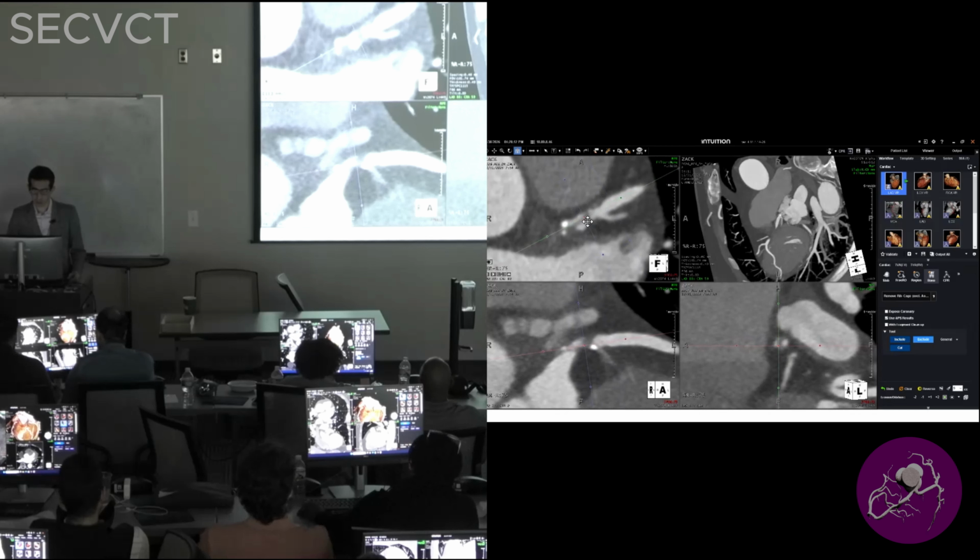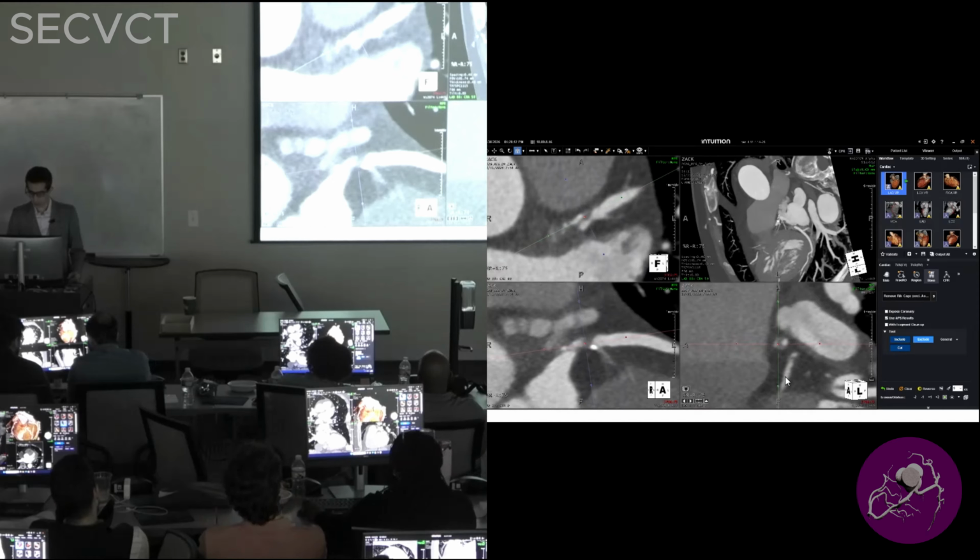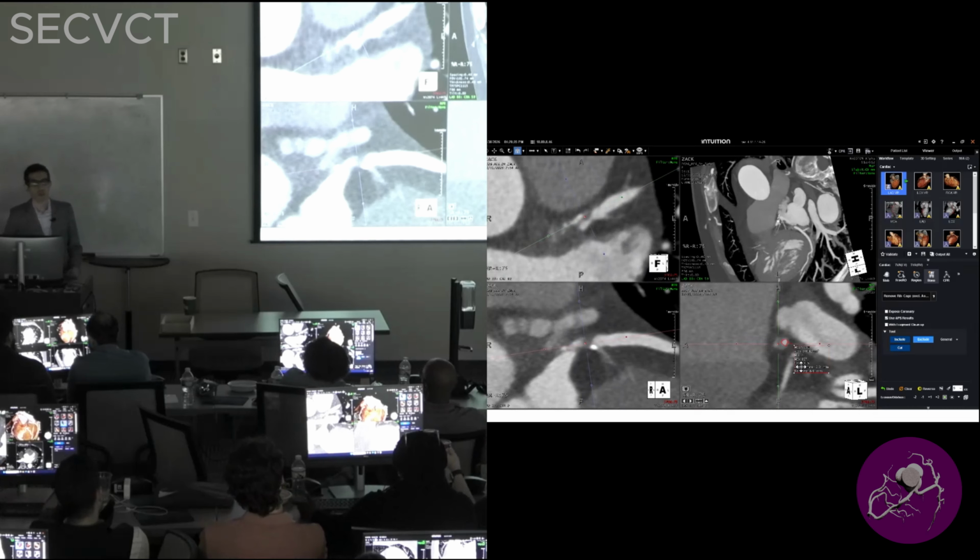So here, you go a little bit this way, and it's still getting narrow. So this area is not bad to measure. So if you could do the same thing, Control P, and try to be zoomed in so you're more confident with your dots. I'm getting an area of 3, so 3 out of 15. It's going to be 1 out of 5, so 20%. So this is 80% stenosis if you just do the math. So this is an 80% anatomically stenotic lesion.